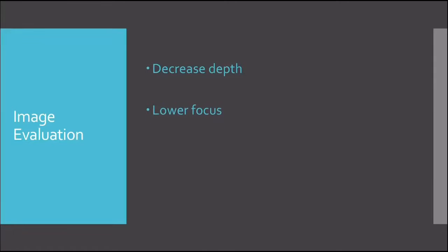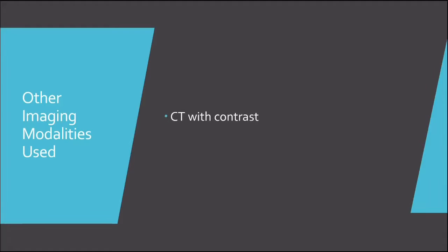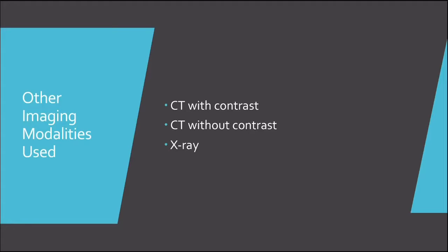So for image evaluation, I would say perhaps decrease the depth, lower the focus, and do your best to prevent drop-off. But I was there for this, and she was in a lot of pain, so I think that we did the best we could. The other imaging modalities used were a CT with contrast, a CT without contrast, and X-ray.